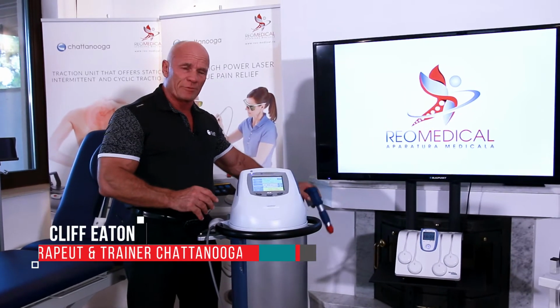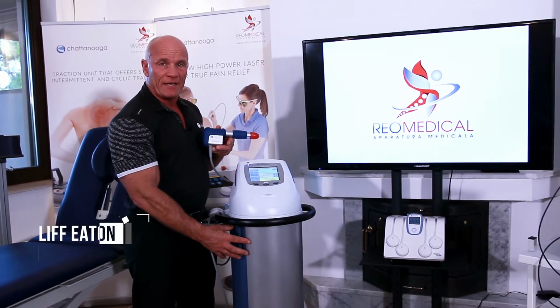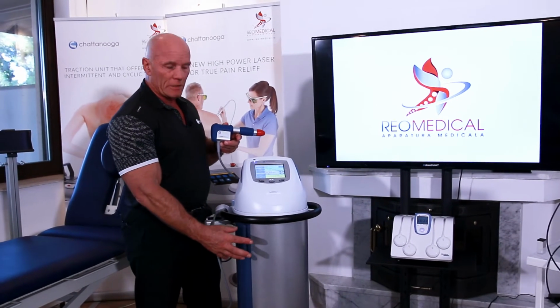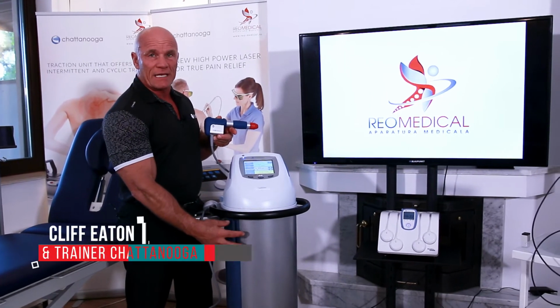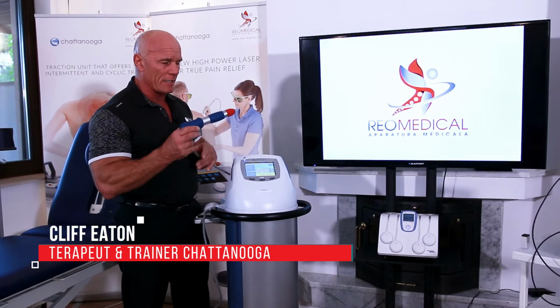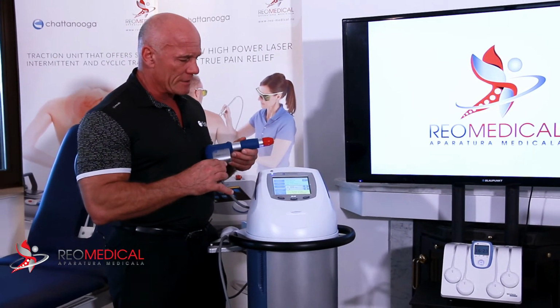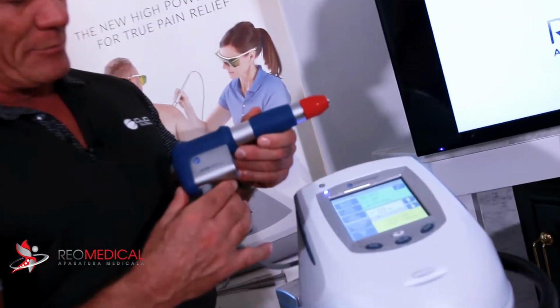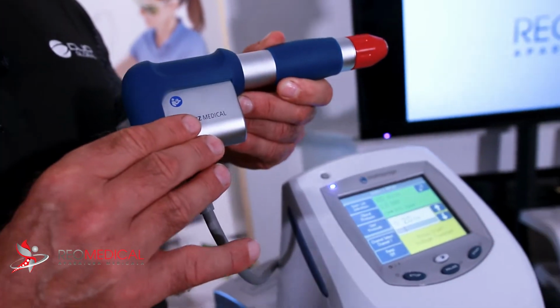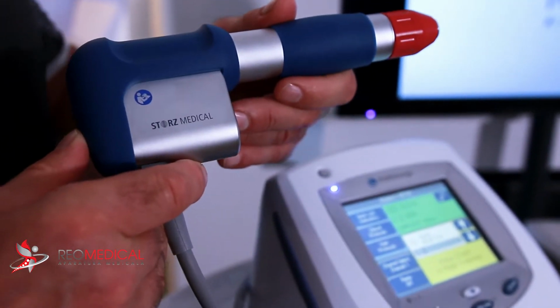So your radial pressure wave machine uses compressed air. Now the compressed air can come through an oil compressor or an air compressor. My recommendation is always air compressor because it requires no service on our parts as clinicians. And the compressed air comes into this handpiece where there's some very clever valve technology. This particular valve can open up to 21 times per second.